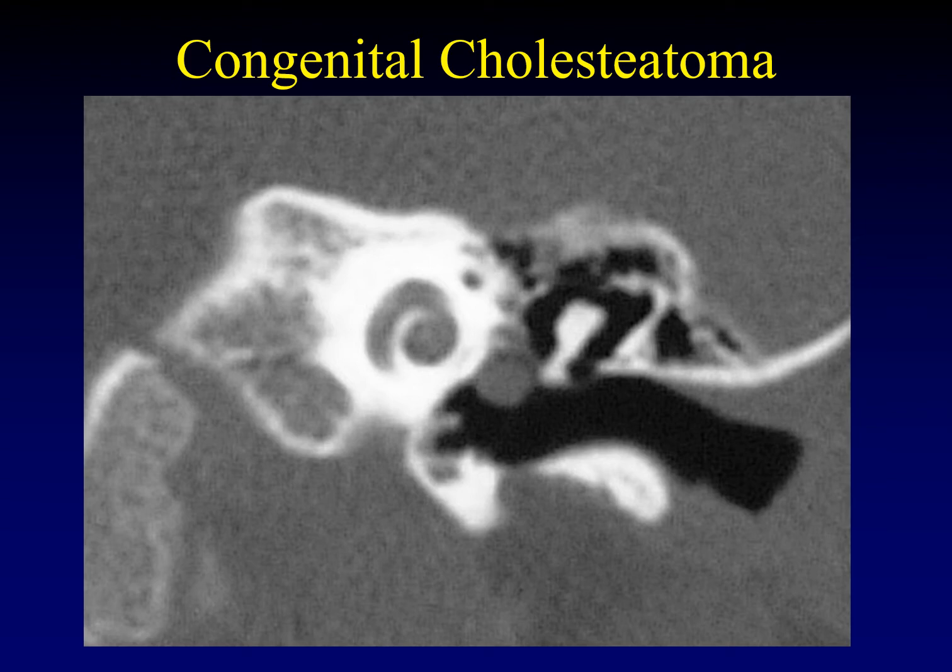This is an example of the other type of cholesteatoma, the congenital cholesteatoma. This is a zoomed-in image of a coronal temporal bone CT slice. There's the scutum, and there's the malleus, and here's Prusak space. You can see that this little ball of cholesteatoma is nowhere near Prusak space because this has nothing to do with that whole recurrent infection, pars flaccida nonsense. This is an entirely independent way of getting a keratinaceous pearl in your middle ear, and these can occur anywhere within the middle ear. I like this example because it shows the congenital cholesteatoma to be somewhere near the cochlear promontory, right? It's a little anterior, but near the cochlear promontory.